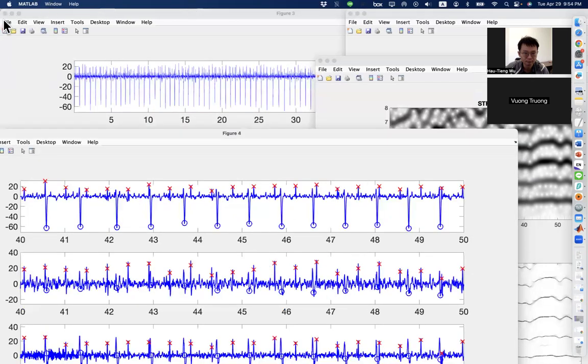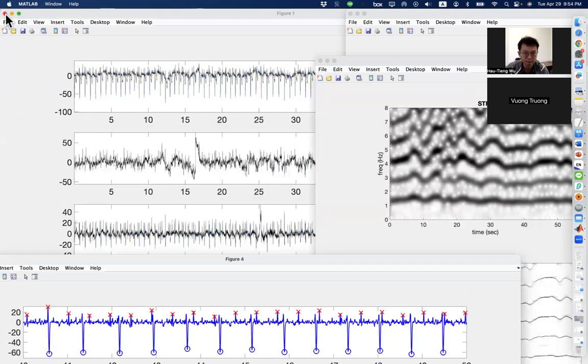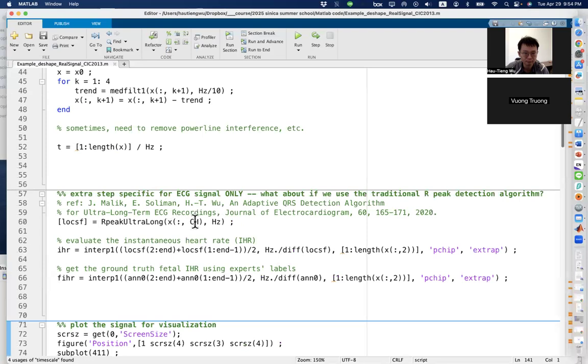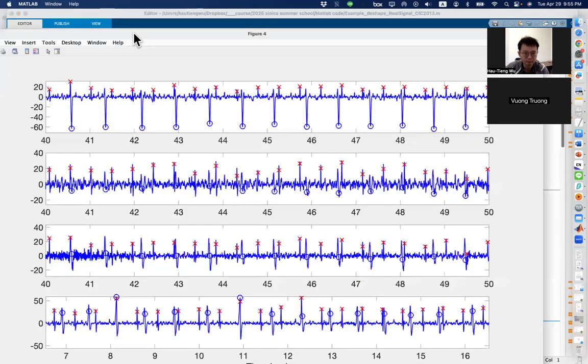Let me double check. See if, well. Let's see. So this is okay. I already used the fourth channel. Okay, well, fine. Then this is a very good case. So, anyways, you get very nice R peak detection and so on.